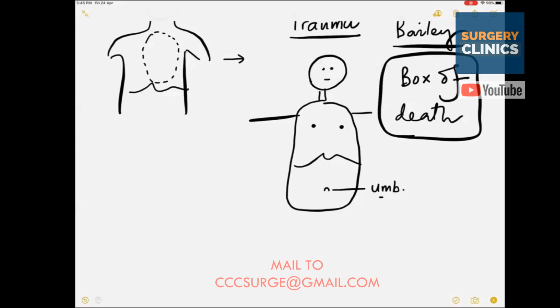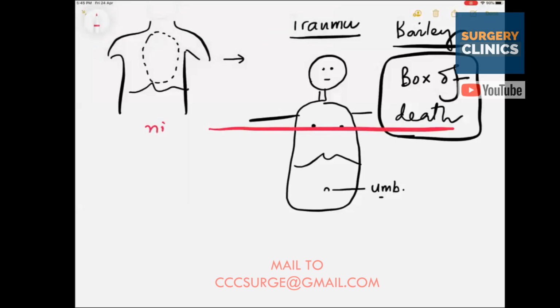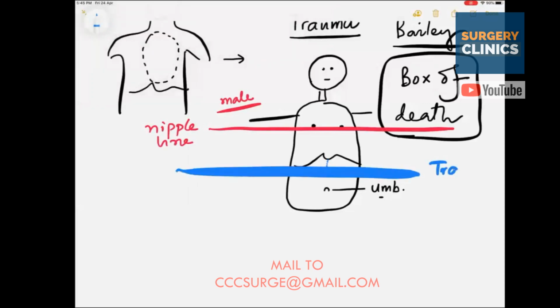So what you do is make two lines very quickly. The first line passes through the nipple, the nipple line, particularly in a male. The next line passes a finger below the xiphoid, so this is basically the transpyloric line, very simply.